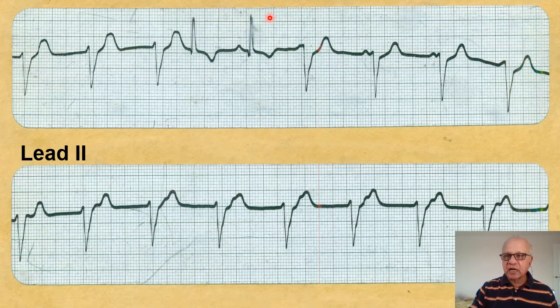Now the questions here are, what is the arrhythmia which you are seeing? Second, identify the types of QRS in this strip. There are more than one type of QRS in this rhythm strip. Third is what could be the cause of this arrhythmia, and what is the underlying heart disease which caused the arrhythmia. And then the fourth will be, how will you manage this arrhythmia, or what treatment you will give the patient. So about 2.5 to 3 minutes, right? You can proceed to answer the questions.